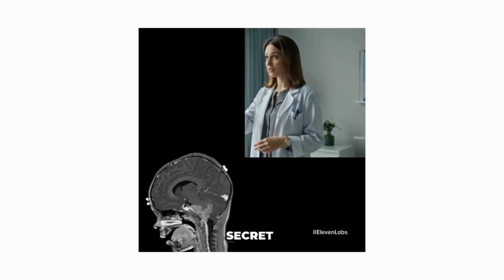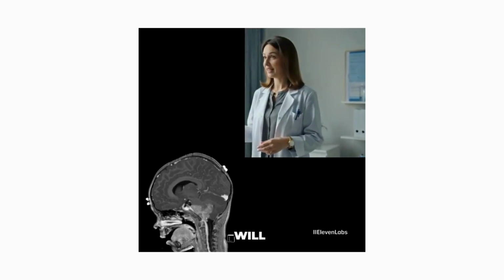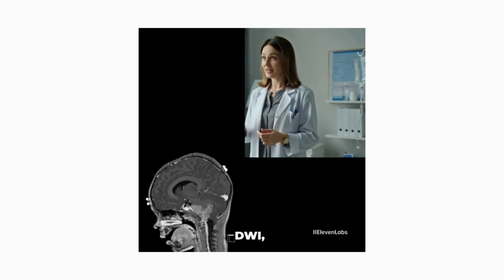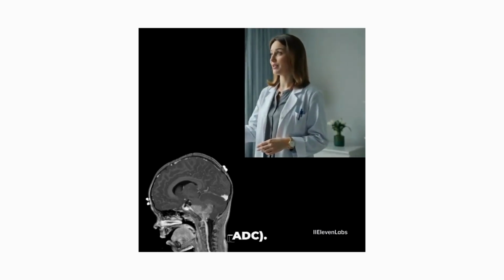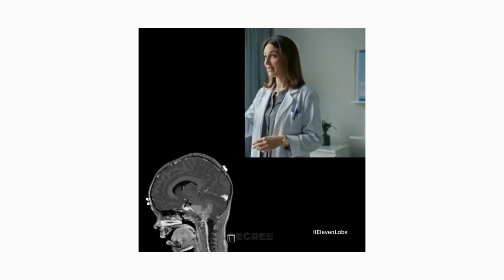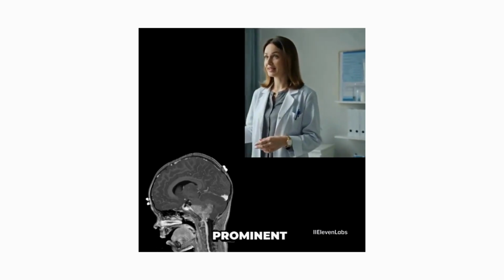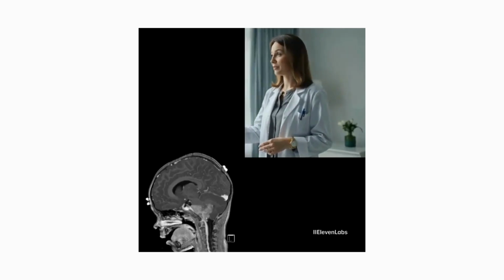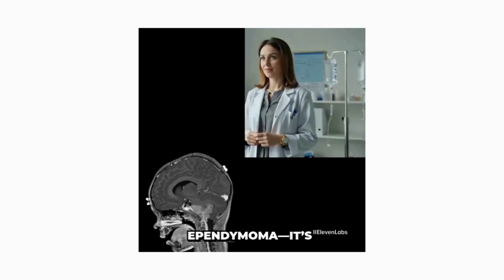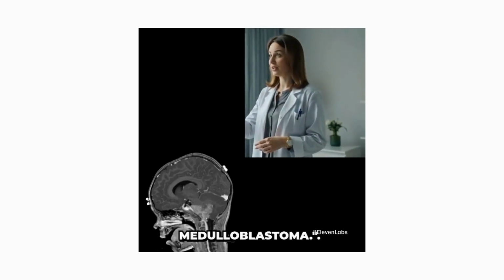Diffusion, the secret weapon. Medulloblastomas are highly cellular. This means you will almost always see restricted diffusion, bright on DWI, dark on ADC. Ependymomas are generally less cellular and won't show that same degree of restriction. Calcification. If you see prominent calcification on CT or susceptibility-weighted imaging, think ependymoma. It's much more common there, about 50%, than in medulloblastoma.